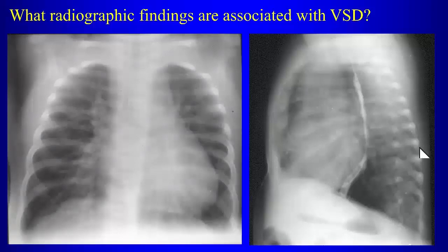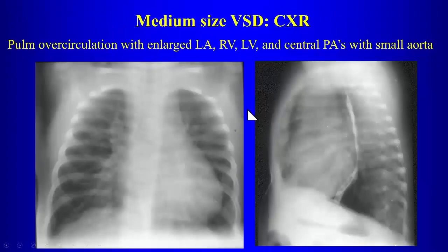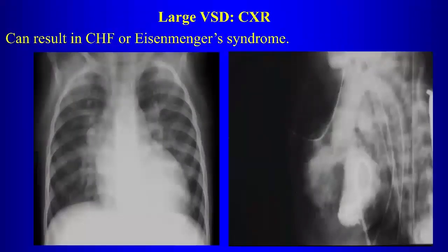So the left atrium will be enlarged, and you can see here the indentation on the esophagus from left atrial enlargement. What else? Yeah, both ventricles, right? So biventricular enlargement and enlargement of the left atrium. So we kind of covered that last time also, all right? So biventricular enlargement and left atrial enlargement with pulmonary overcirculation.